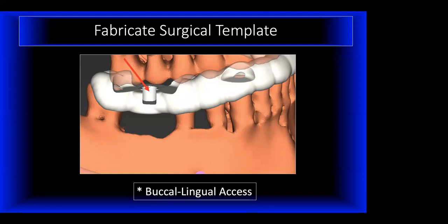What they do is they have the buccal or the lingual open on the tube. The tube, which prevents any misalignment of the drill, is about 5 millimeters in height. They just take out the buccal or the lingual, so you actually slide the drill in from a buccal or a lingual access.